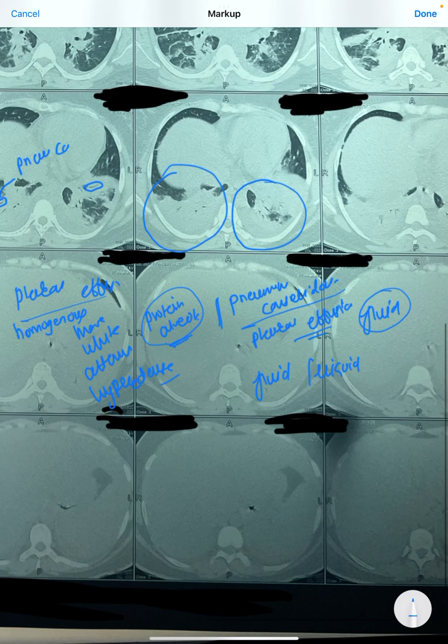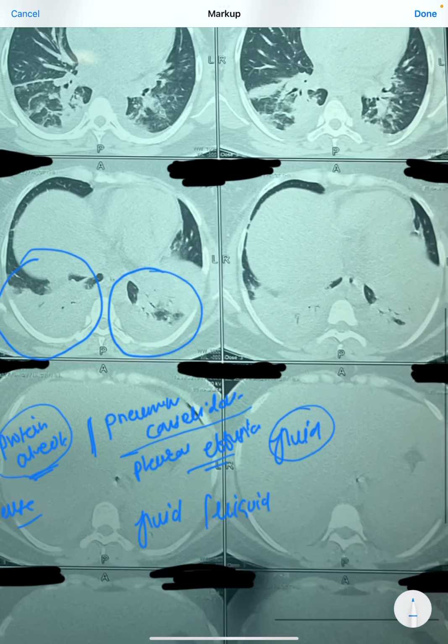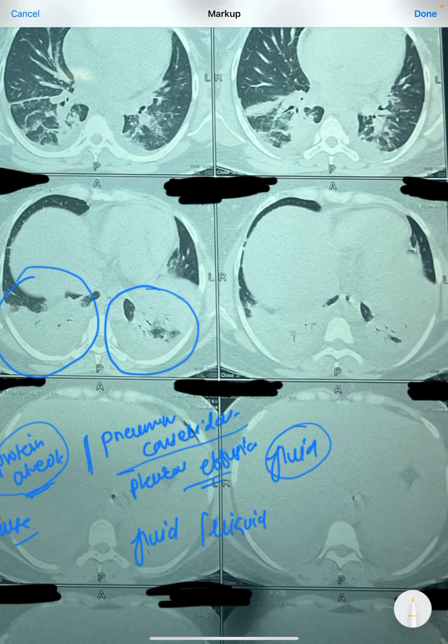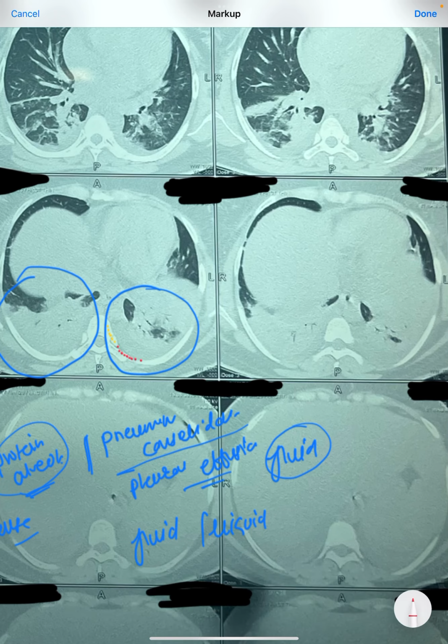Now whether this patient has effusion or not, you can simply zoom in and try to find it out. When we zoom in, you have to look very closely that here, which I am marking, are definite two layers. This is more homogeneous.